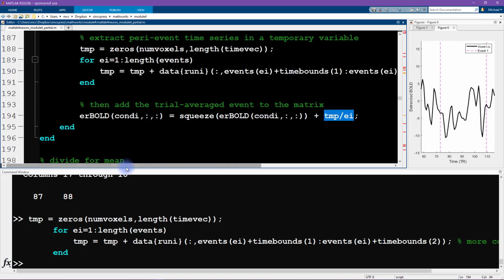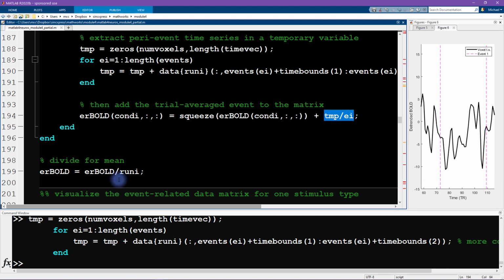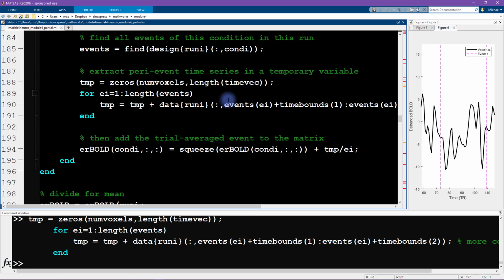Whew, that's quite a lot of code. You can see that, even relatively simple things that you want to do in MATLAB can start getting pretty hairy, but I hope that this all made sense.